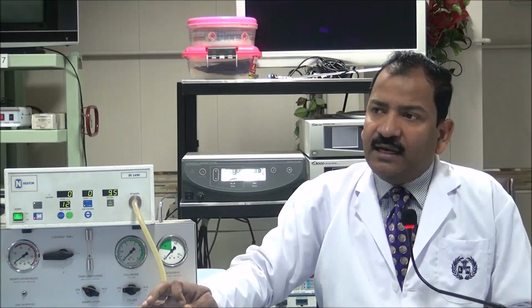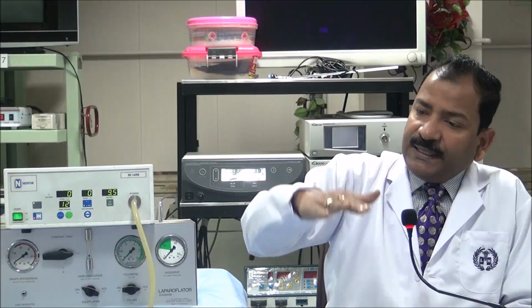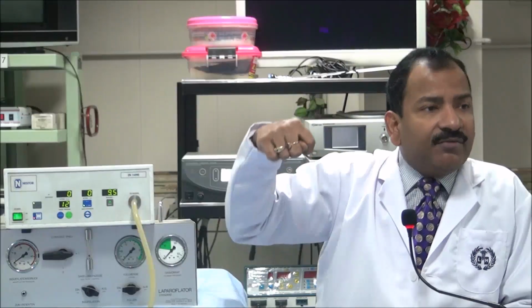Another patient, with a nice muscle relaxant and general anesthesia, it will be possible to introduce 3 to 4 liters of gas to get the same pressure of 12. So that's why GA is better, because more gas means we are more safe. Because more gas means the space between the bowel and abdominal wall is more, and then our first trocar is easily and safely introduced inside.